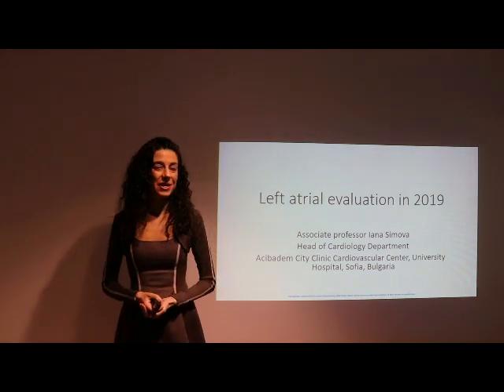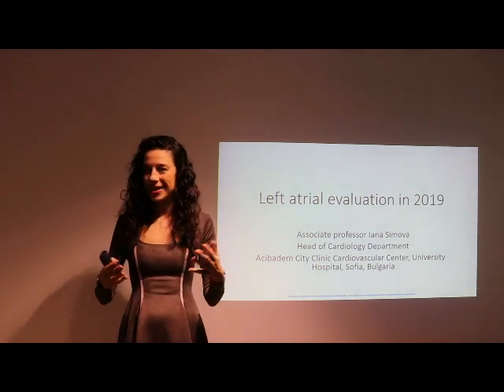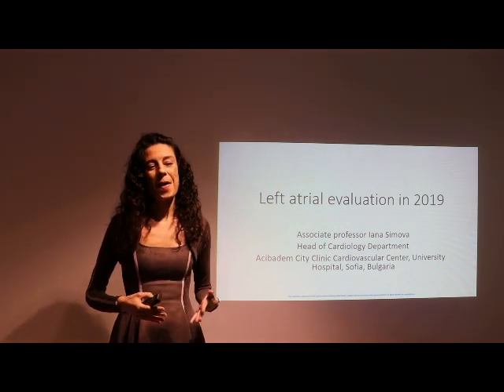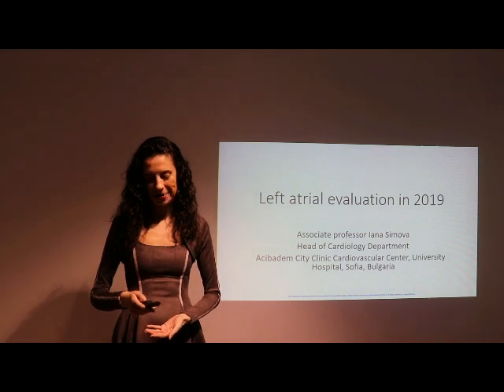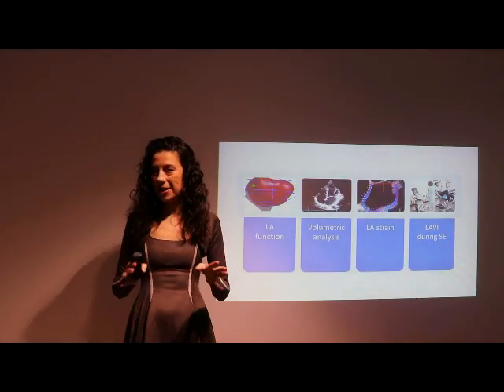So, if you are interested in seeing and watching what is new about the left atrium in the last year, then please keep on watching. In this video, I am going to talk about several things.